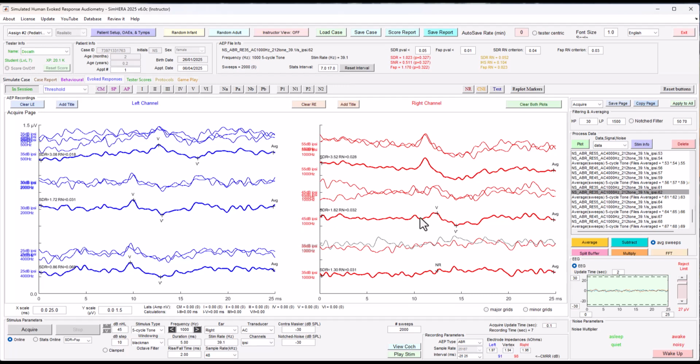And just in case the computer crashes, but also for tracking, I knew to go to 55 dB instead of going to 65 dB because threshold for 500 was at 45 dB and 50 dB for the 2000. So it's likely that you're going to have a response being present at 55 dB and possibly even 45 dB. So I went a little bit higher than the 50 dB at 2000 just to really see that nice response. I probably should have gone at 45, but it's a questionable judgment which one to go to.